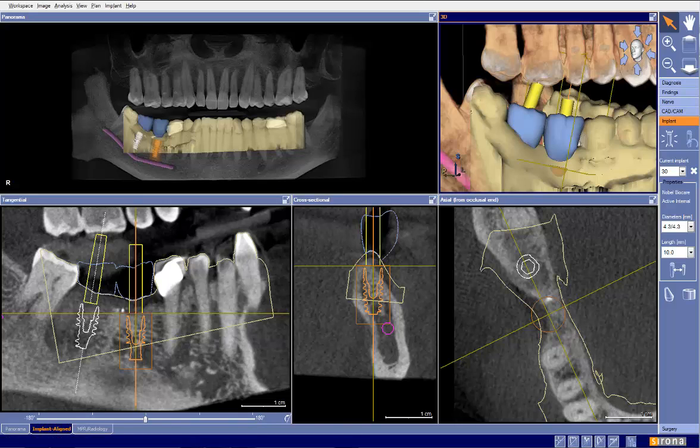Welcome. Today's video, we're going to showcase a case that was sent in, missing tooth number 30 and 31. According to the notes that were sent in, the patient lost the bridge from 29 to 30 to 31, removed tooth number 31 in May of 2014, did socket preservation with Orograft, which is a bone material. He planned the implant in site 30 and 31.